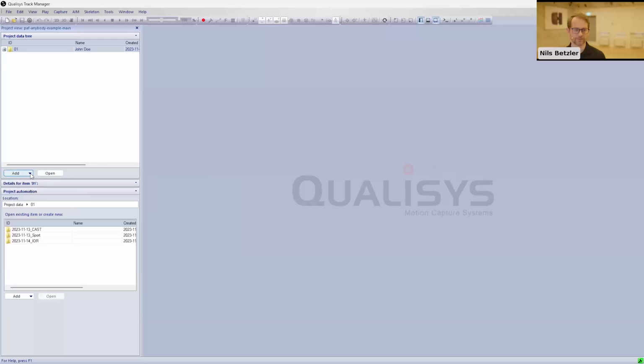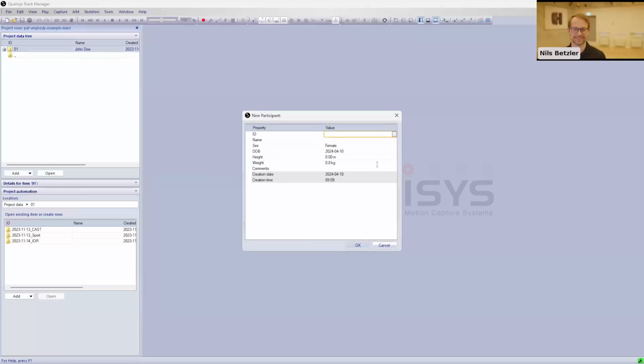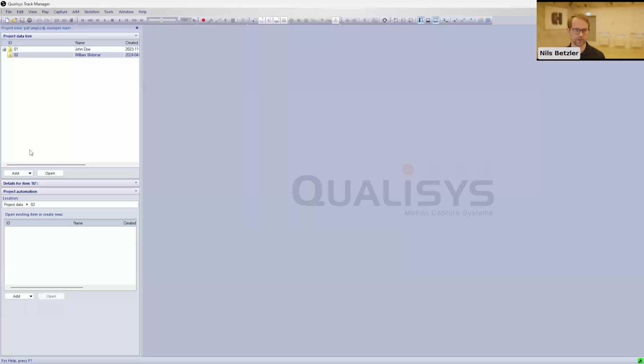Now I will add a session for today. Sorry, wrong click here. I'll add a participant. For today, let's call our person William Webinar. I happen to know that he's 1.83 meters and 71 kilograms. Okay, so now I have a folder and I'll add a session.